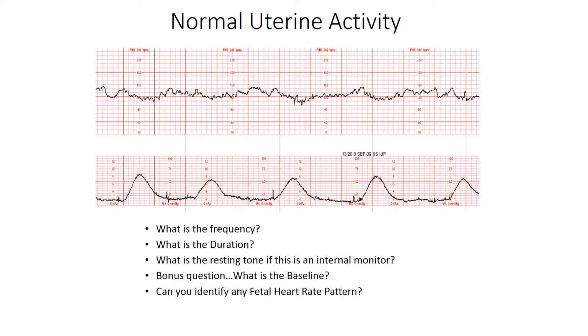And a bonus question, can you identify this fetal heart rate pattern? Actually, the bonus question was, what is the baseline? But can you identify any fetal heart rate pattern? In order to do that, I'm looking in between contractions. I'm getting that baseline, about a 120 to 130.